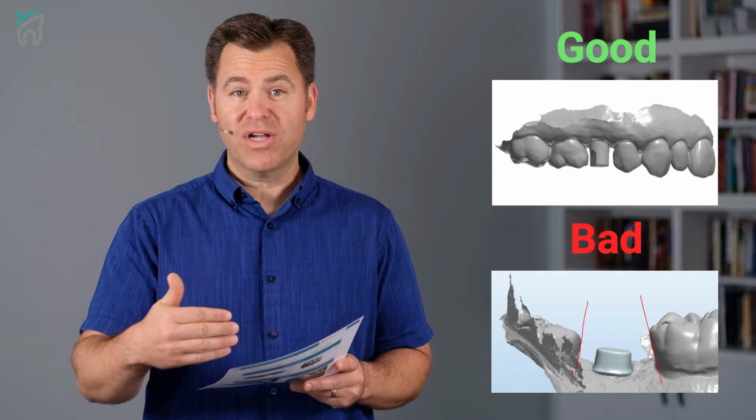But you can also watch for that on a single tooth preparation. You know, we look for parallelism on bridges so that they'll draw. But also just remember to check the adjacent contacts so that they'll draw. So check your parallelism in more than just a bridge preparation, also on the adjacent contacts.